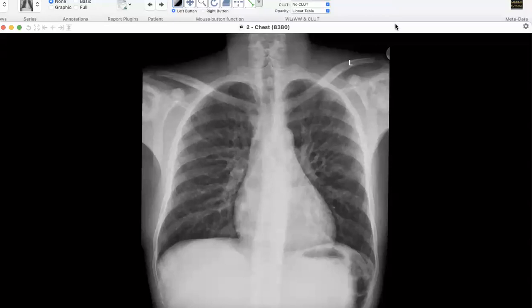There are bilateral congested hila with evidence of venous diversion to the upper side. There is diffuse reticulation noted involving both lung fields with suspected Kerley B lines.